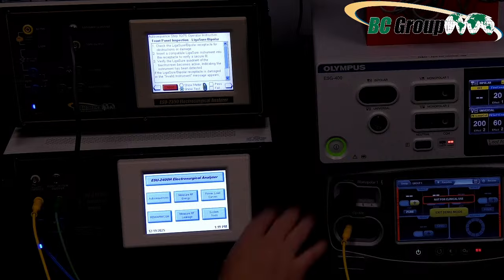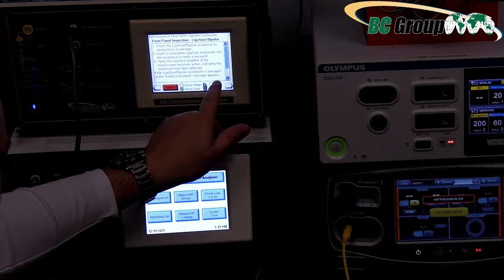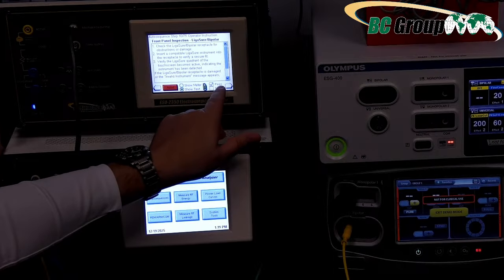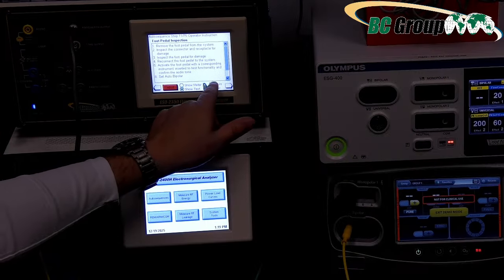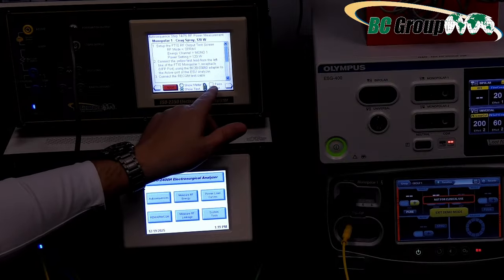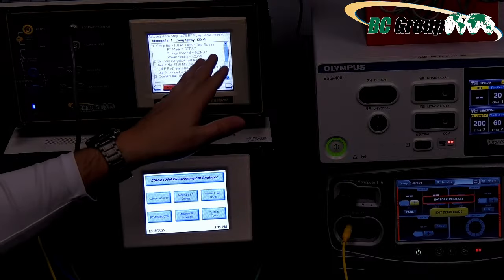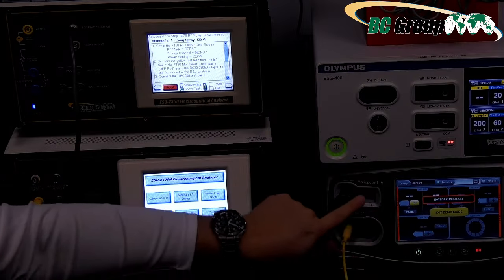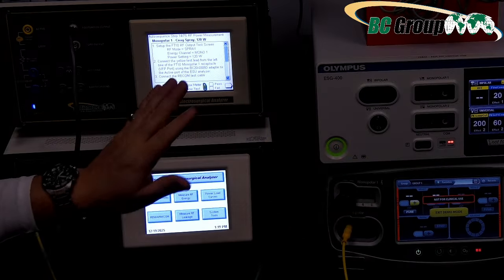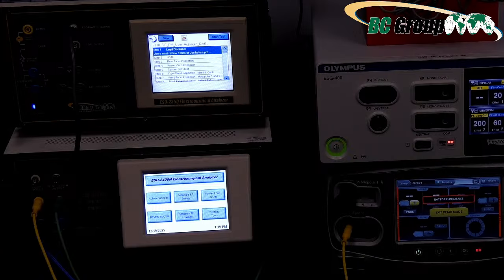It's called various things with different ESUs. So anyway, let's go to the next. There are a lot of steps to these, by the way. You're checking the audio. And now we are on monopolar, and it tells you to set it to a certain level. We're using this guy right here. I'm not going to go into that, guys, okay? We will do some energy discharges, and I'll show you how to measure it over here. But we're not going to go through the PM proper, all right?